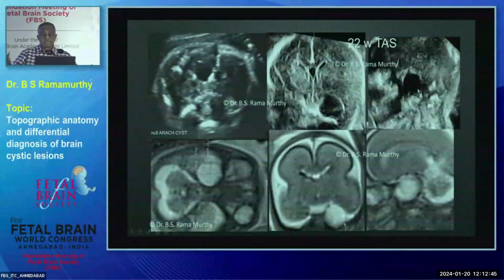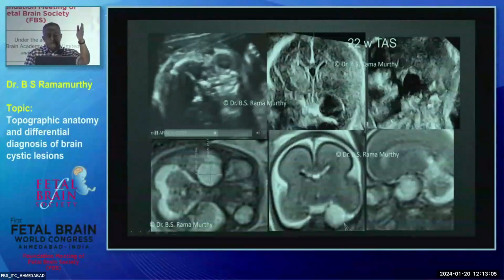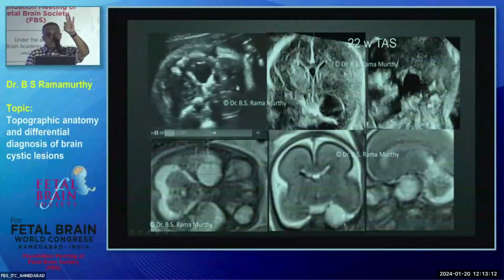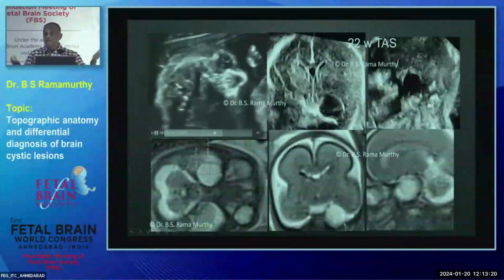So where do you think this is? Midline, off midline. And now answer the question, is it axial or extra-axial? Look at this. Extra-axial, right? And then what is the last? Infra or supra? Supratentorial. Why do you think it's supratentorial? What fossa is this? I'm giving you the word, fossa. How many fossae? Anterior, middle, posterior. Which one does this cyst occupy? Middle. And middle is supratentorial.